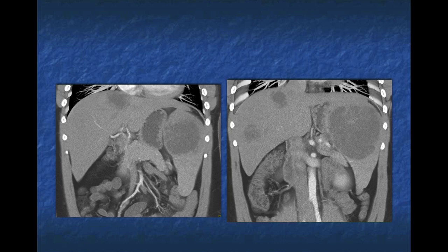Now I'm telling you there are liver and splenic lesions. When you have liver and splenic lesions, it's not always malignant, right? Because sarcoid gives you liver and spleen, but this does not look like sarcoid in any way, shape, or form. And I have to admit the liver lesions and splenic lesions are irregular. Again, you can consider abscess, but what kind of abscess is so large?